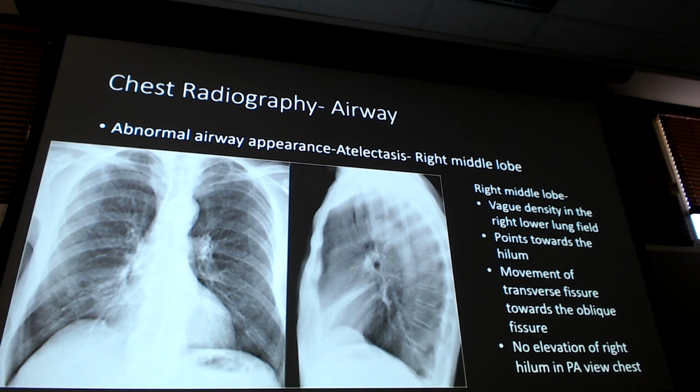Luckily, I have a lateral image here to look at, and when I go through, this is my triangular radio-opaque area. Now that can get tricky because it's almost in line with those axillary ribs that are coming across, right? But what do ribs not do? Ribs don't come to a point. Also, this is more radio-opaque than all of the other ribs in this section. So yes, it does look like it could be overlying a rib area, but it's those other signs that tell you that it's not a rib. So it's this small little triangular guy here, right in the middle lobe. That is my atelectasis right there.